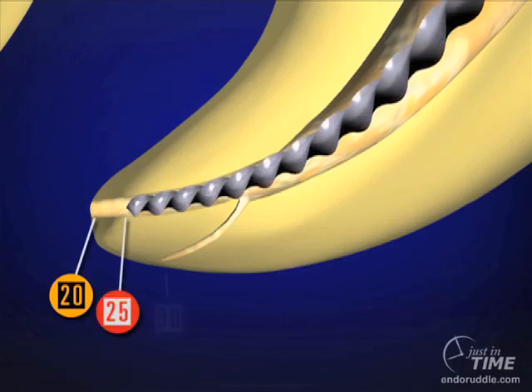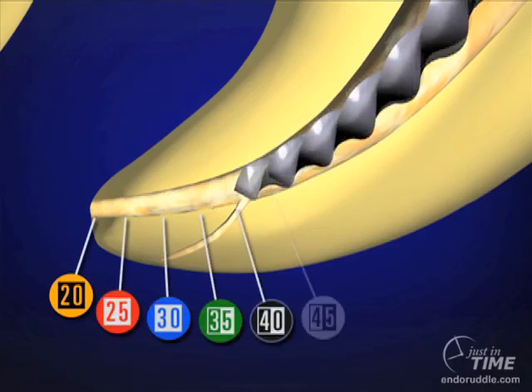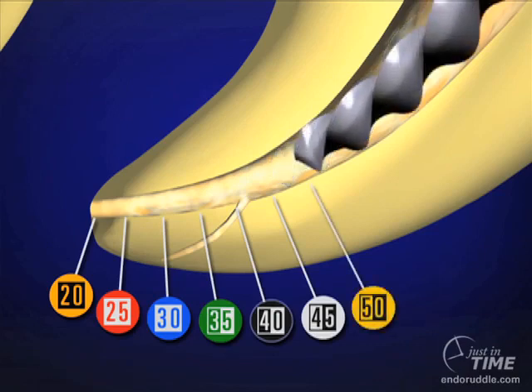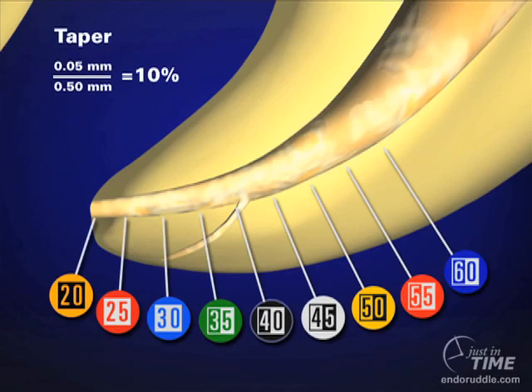If we were to look at this in animation, we're just saying that tuning is a clinical activity where we confirm that each larger file uniformly backs out of the canal.